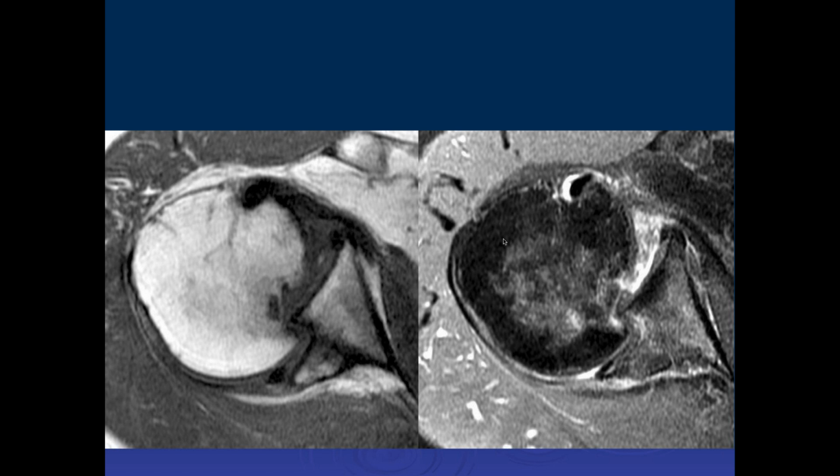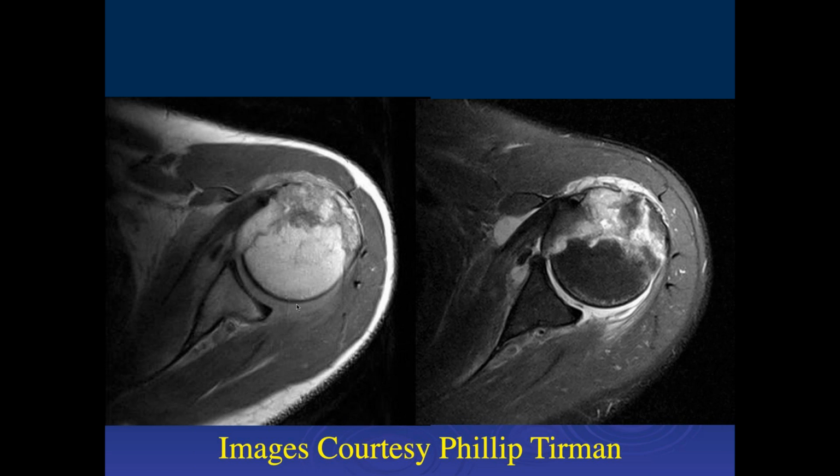Okay, here we can see that there's some posterior subluxation of the humeral head and impaction injury there. Displacement fracture in the posterior glenoid, as well as a reverse Hill-Sachs injury. We see extensive edema, maybe a minimally displaced fracture involving the greater tuberosity, and it also extends intra-articularly.